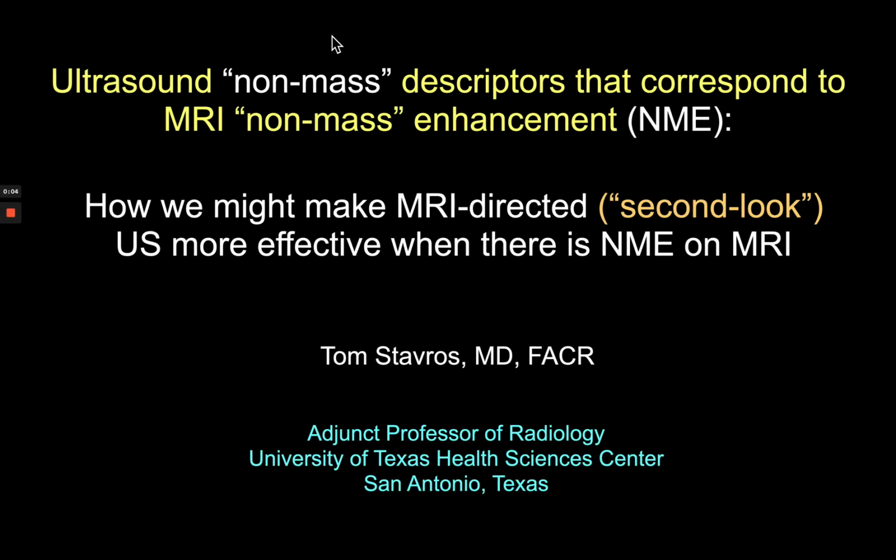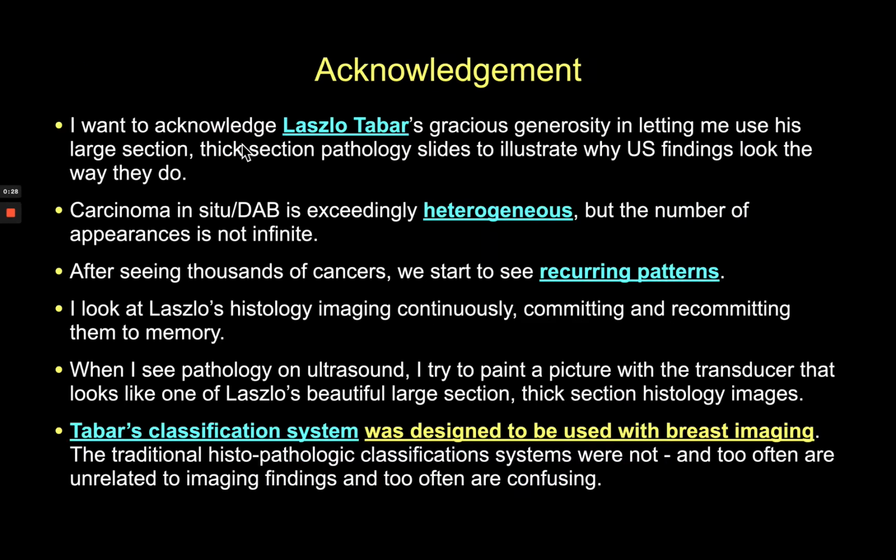So in this presentation, I'm going to talk about understanding how non-mass feature descriptors in ultrasound that correspond to non-mass enhancement on MRI can make us perform better in second look ultrasound, particularly when the cause of the non-mass enhancement on MR is so-called DCIS.